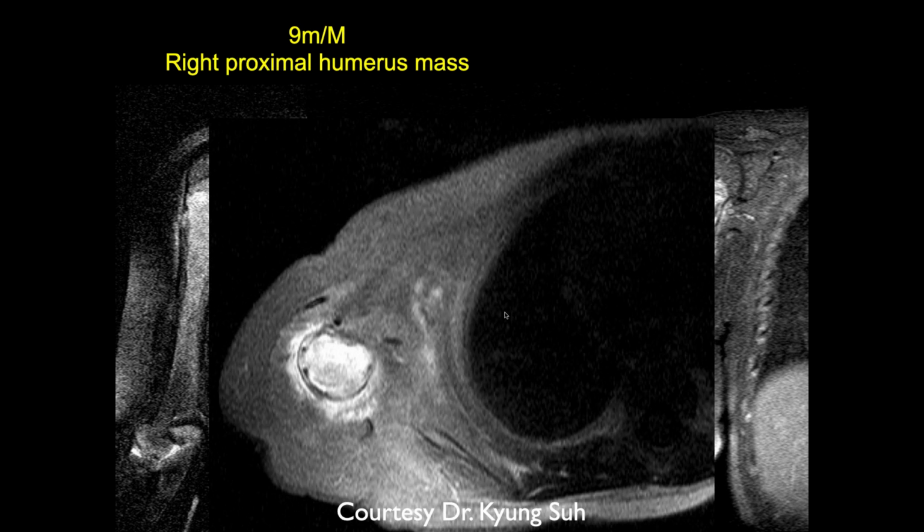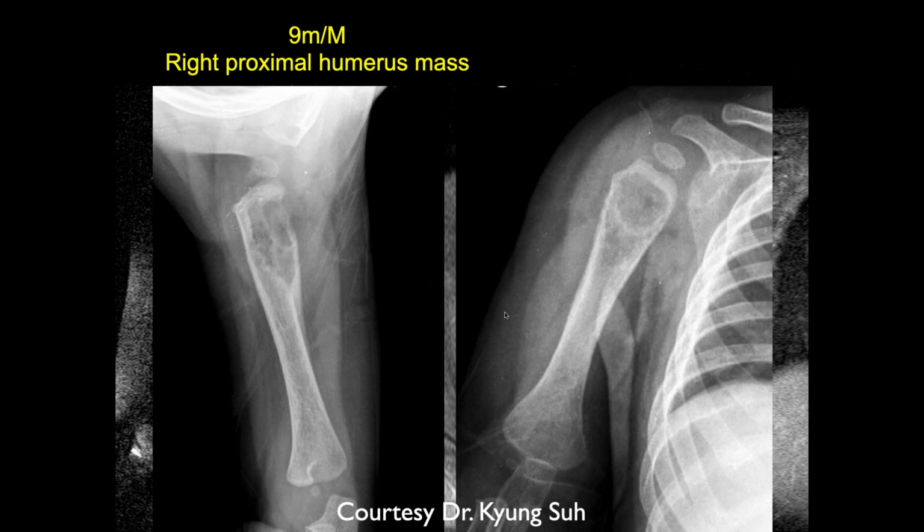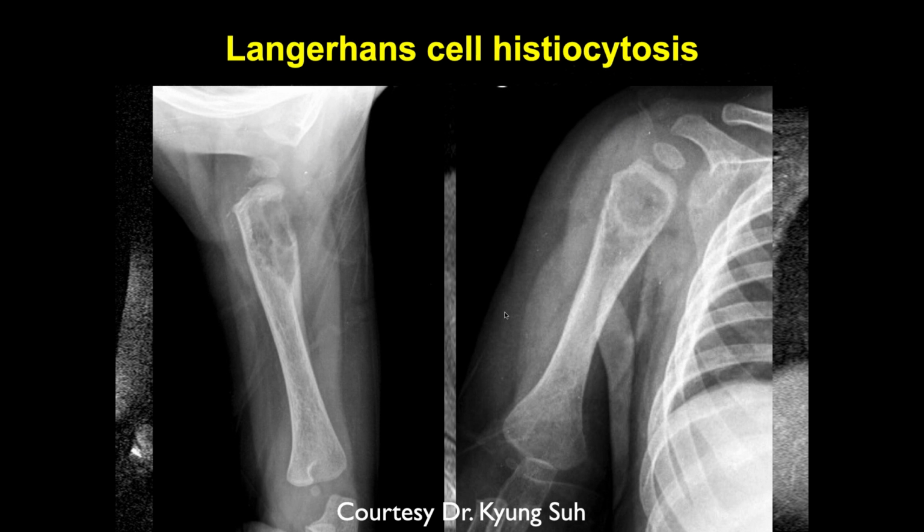First thing I think about is infection. Okay, good. It's going into the soft tissues as well. You can think of EG, or that'd be atypical, or Langerhans. Okay, Langerhans cell histiocytosis. More aggressive EG in this particular patient.